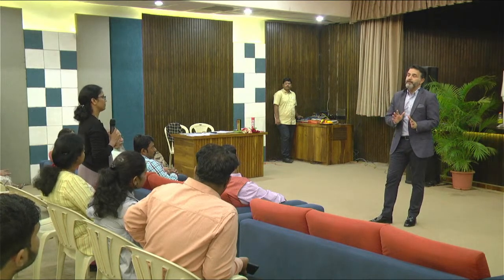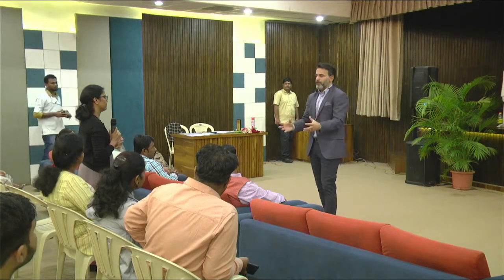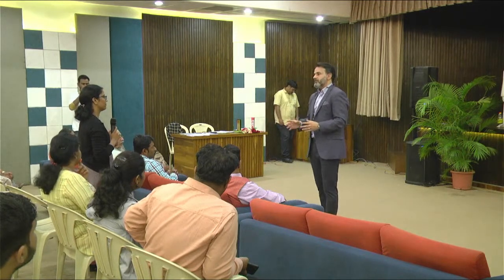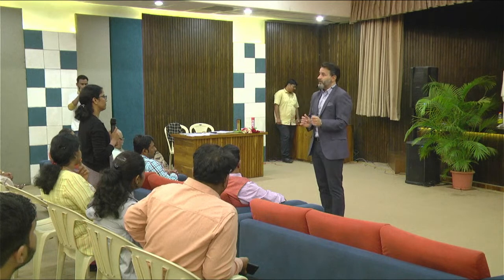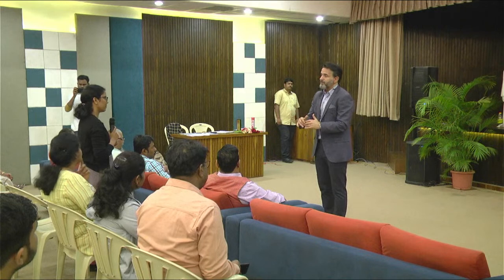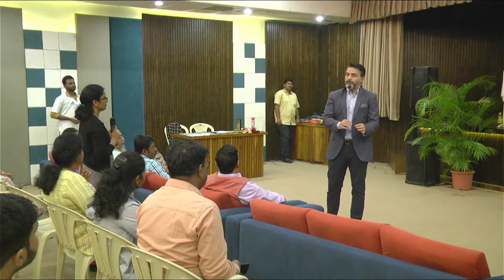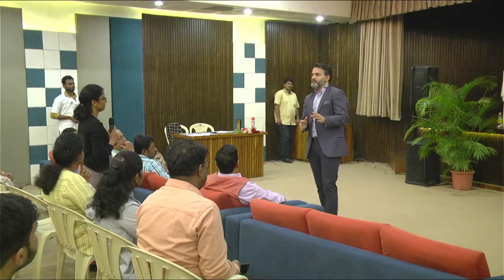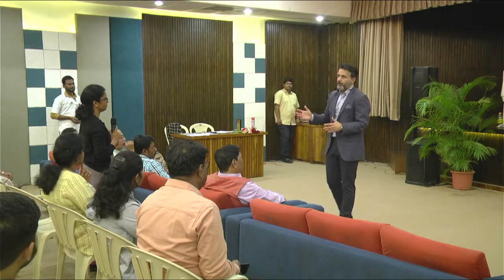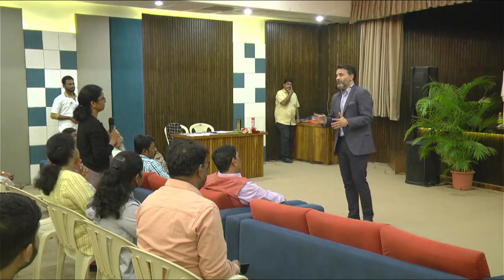Okay. And yes, we have so many drills. Sometimes you get confused when you look at the drill. Once you understand the philosophy of this set, it is very easy to use it. Why? Because there are no adapters, there are no spoons added to the normal implant kit. You have a special kit just for this job. So if you start from the start drill and follow the pathway, for example, this is 11.5, and you do first, second, and third, then it is over in 3 or 4 minutes.